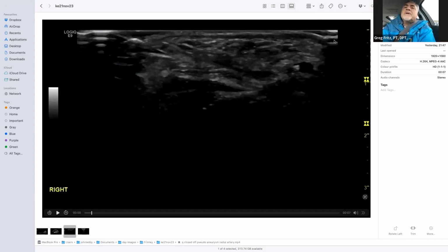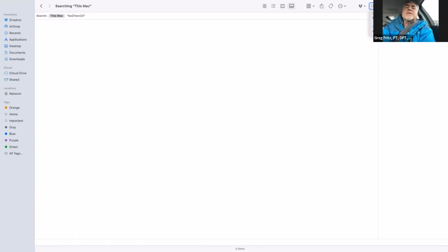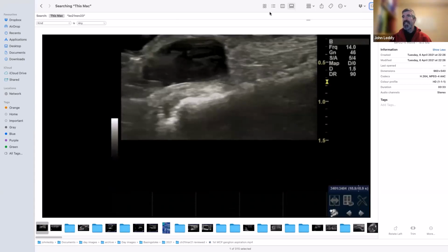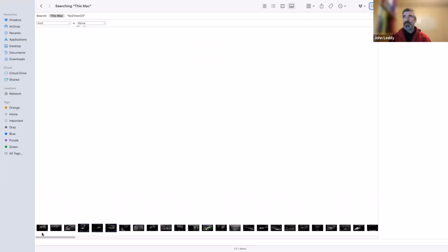Now, was the grayscale of the image part of why you thought that it was blood, or were you saying that that really is the mechanism anatomically for what those things are? Yes, I've definitely seen similar things before, and that's what it looked like. I would never say that's what it was, but that's what they look like. That's something that you recognize as being similar to what you've seen before.